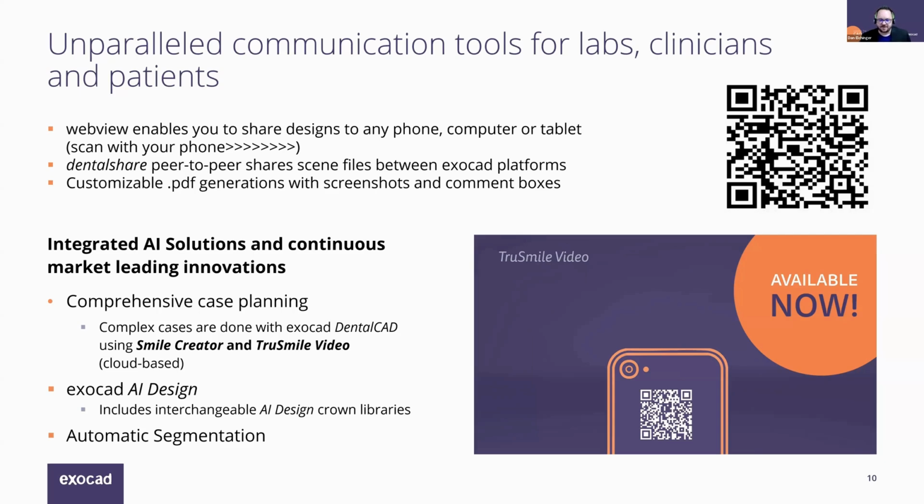you can actually edit them in Microsoft Paint. You might want to add arrows pointing out something or add text to really paint the picture of what's going on with this patient's case, where you need either guidance from your customer or approval for fabrication.